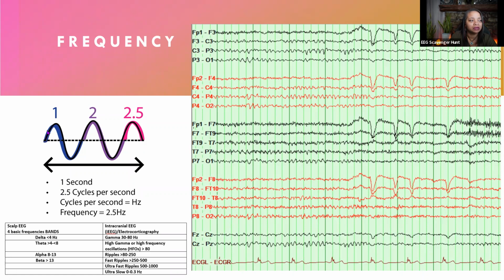It starts here, it cycles, it ends, and you can see now here in purple, this looks like the beginning of the first cycle. So here we go with cycle 2. It cycles through, it ends. And then here you have a new cycle that's starting, but it didn't complete before the second was up. And this duration here is arbitrarily marked as 1 second for demonstration purposes.